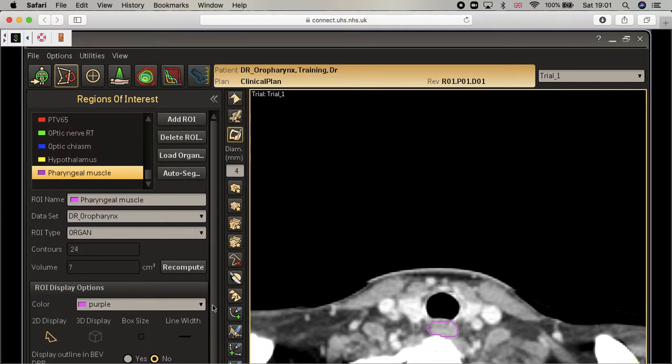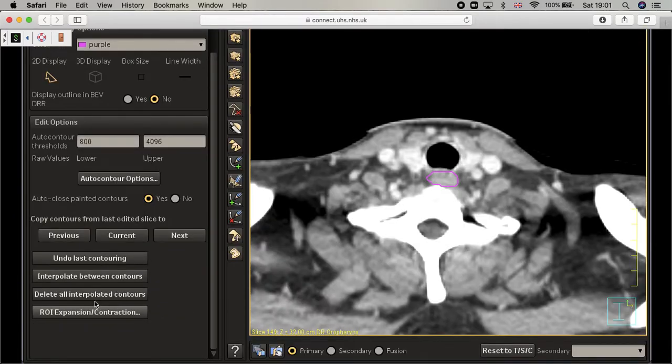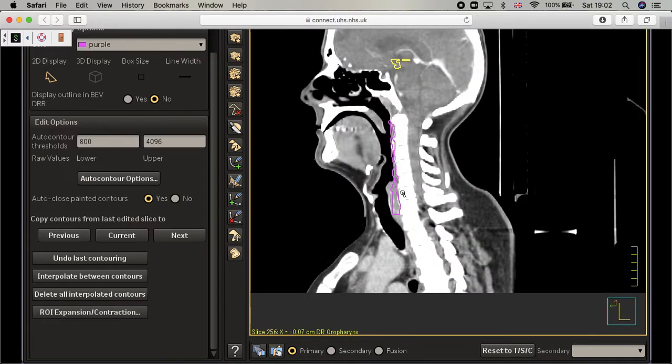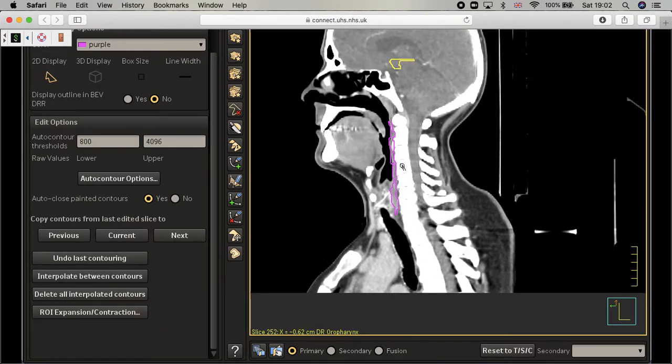If I interpolate this all, you can easily see that it's one continuous structure. I think this is the easiest way to do it. You don't have to separate, but if you are interested in more anatomy, let me review it with you, and then we can decide where to go. Okay, so it's one. I think it is some thickening. So it's one structure from above downwards.